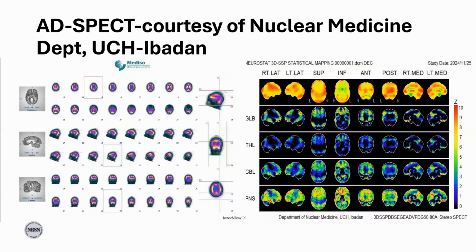Now, the map here can either be an increases map or a decreases map. So it's not just telling you about perfusion, it's to confirm what you have seen on your perfusion study. On perfusion studies, we have seen that there is a paucity or hypoperfusion of certain areas of the brain. But this 3D statistical map just increases your confidence that what you saw is actually there, or it's not there. Now, you will see this area with DEC here, it just shows that it's a decreases image.